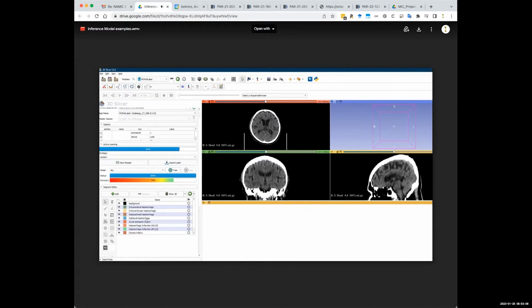These are the labels I described to you earlier that I edited the deep edit module with. You can see that most of these labels are actually not going to be relevant today. They are related to other types of stroke. And this is what I call future proofing.